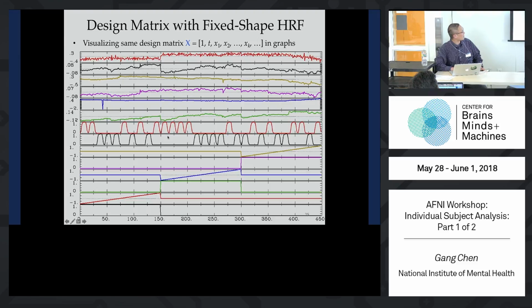So the next two rows, the red one and the black one, those are the regressors of interest, right? So immediately we see the pattern here. So this is probably the better way to visualize, to check whether you make a mistake or not. Mistakes, like you put a wrong stimulus onset time, that will mess up your model, of course. So the last six rows on the top are the head motion parameters. You were asking before whether you can see the pattern better, right? So whether you have a big dip or big jump, in this case, of course, it's because of the different runs, between different runs, right?